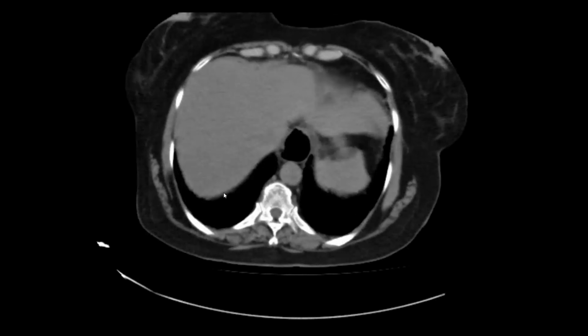So, this is a case of non-specific interstitial pneumonia with mega esophagus, likely a case of scleroderma. I would convey my findings to a referring physician. And this patient needs a comparison with prior imaging and discussion in connective tissue MDT and a further evaluation with the barium swallow if the patient has any history of dysphagia to confirm this finding.